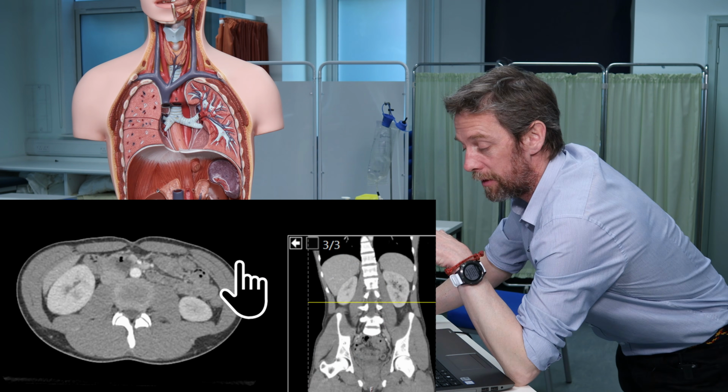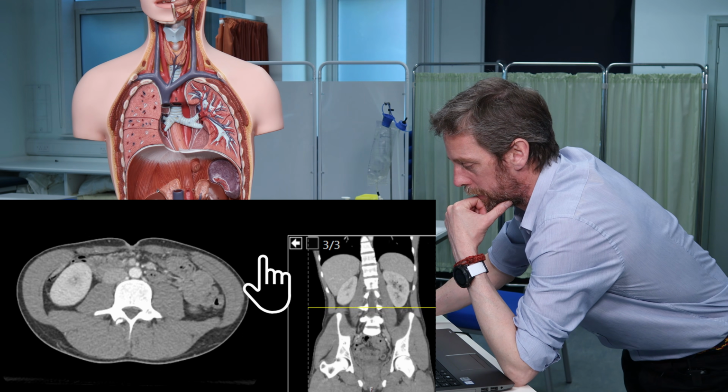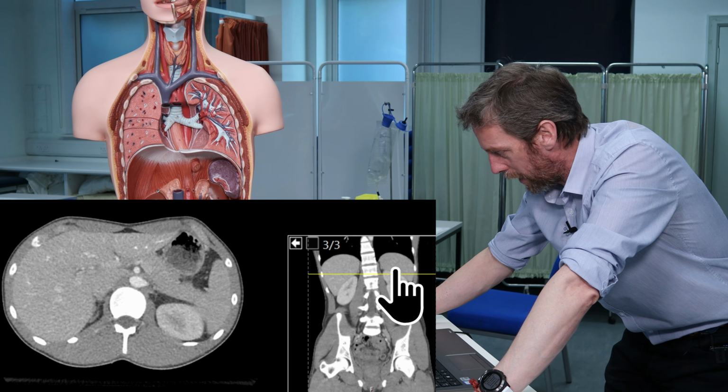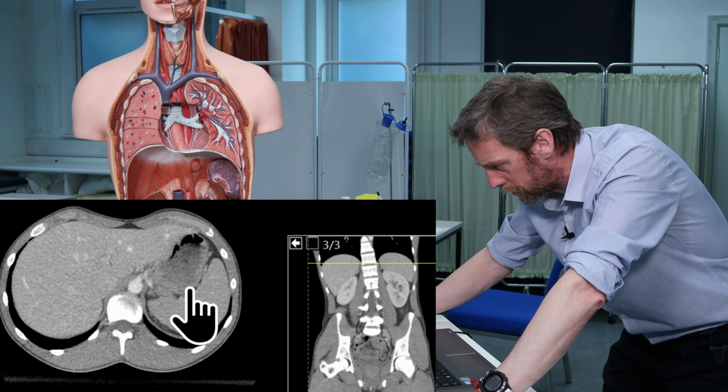Okay, because scrolling up and down like this is easier. If you're just given a section, it can be a lot harder. Right, let's go back to the top. It is important to know what level you're at, and you can partly do that by the things that are around it. Okay, so we're going back up to the top.